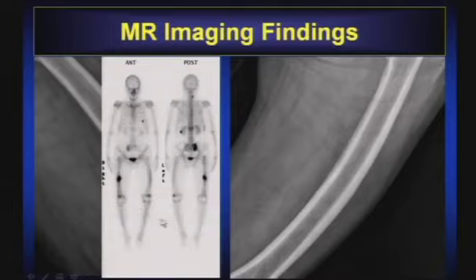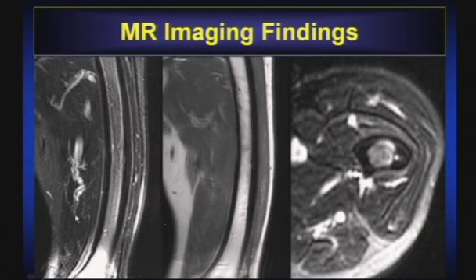There we have our person's nuke med study, which had us move on to an MR imaging study, okay? And these are kind of scary, aren't they? Because the plain film findings are so subtle. So if you have a predisposed patient population, I would not hesitate to say in my dictation, subtle or no findings with clinical suspicion, recommend that this person has MRI.